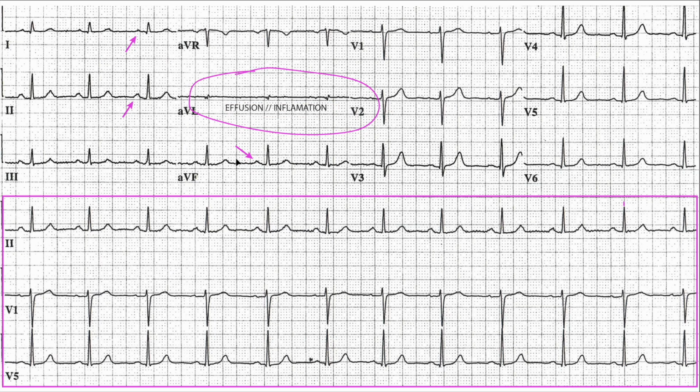If for some reason you just don't have lead AVF, you can go to lead AVR, and you would need lead 1 and AVR. If 1 is upright and AVR is negative, this is coming from the sinoatrial node. There's a great chance for it. It's not 100% certainty, but it is almost 100%. But if you have the option of 1, 2, and AVF, use that. If you don't have AVF, use lead 3. If this is upright, this is upright, this is upright, this is coming from the sinoatrial node.